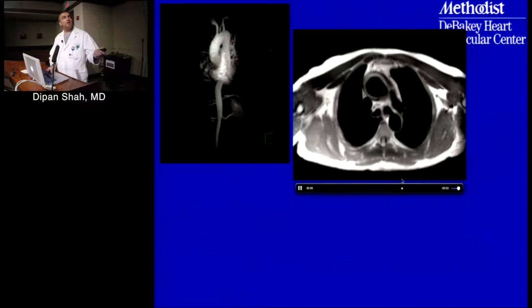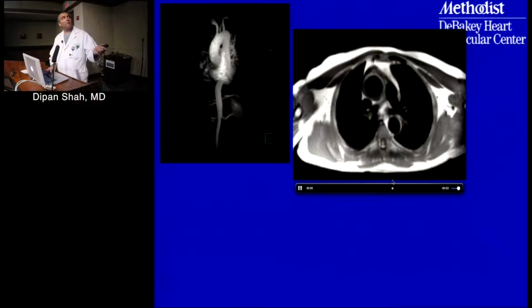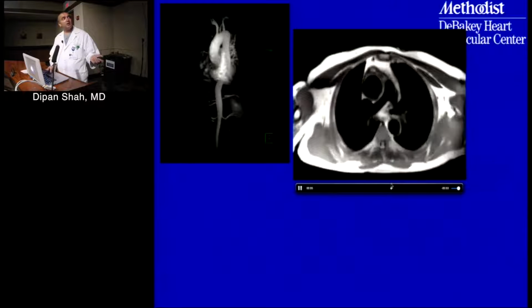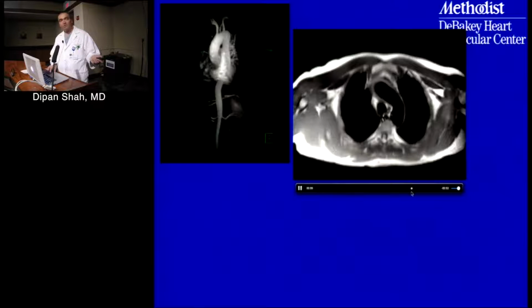So just on the basis of this alone, I think all you can say is that the size of the aorta probably looks a little bit bigger than what we saw in the MRA alone. This could be that there's just some mural thrombus present, or it could be that the wall of the aorta is thickened itself, right? And then you see this most impressively in the ascending aorta, even up to the arch. It looks like a little bit of thickening of the wall, but again, that could just be mural thrombus as well, right?